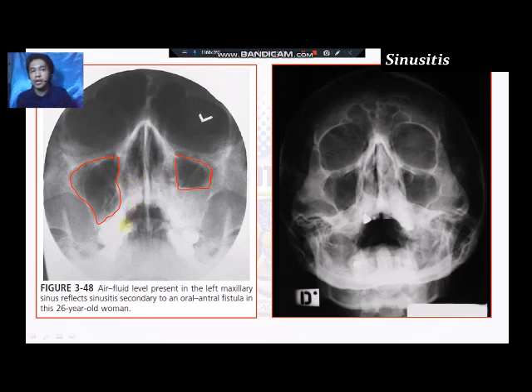So our sinuses, they are filled with air. Okay, so if ever na inflammation, they will be filled with fluid. Okay, so again, sinuses are filled with air. Kung may problem, they will appear as whitish. No, in normal nilang appearance, dapat black unta na sila. Pero kung na sila problem, na sila fluid accumulation, they will appear as white. So kabantay mo ani iyahang maxillary sinus, katunga na lang ang black. So that means this portion sa iyahang maxillary sinus is filled with fluid. That is an indication that the patient is currently experiencing sinusitis.